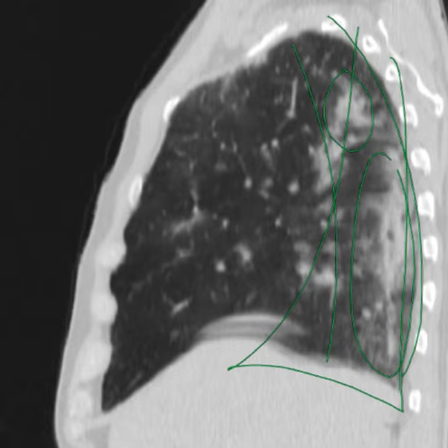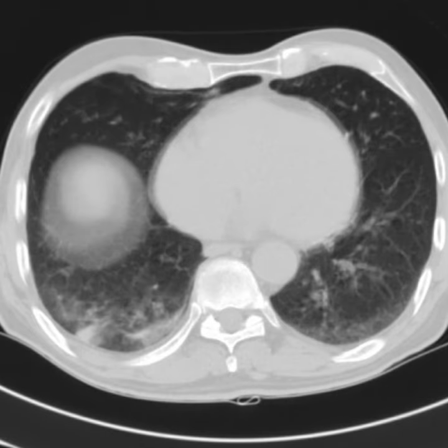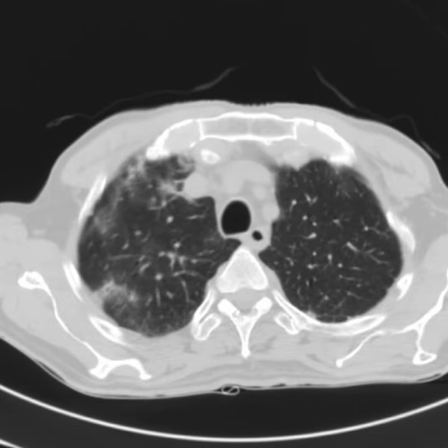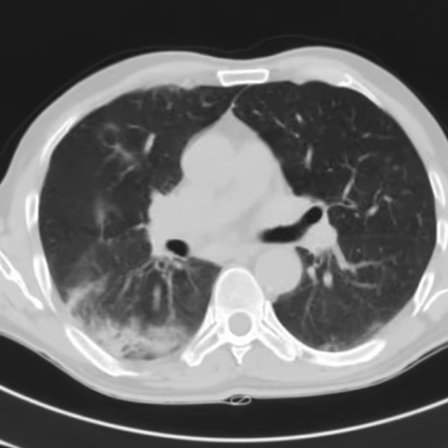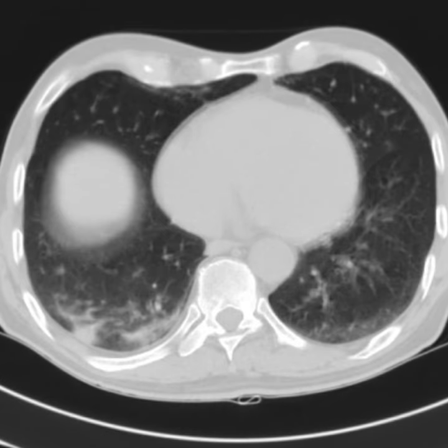So what about other kinds of interstitial lung disease? For example, non-specific interstitial pneumonia. First, non-specific interstitial pneumonia is more common in females, and it usually presents with ground glass opacity, but usually it involves both lungs in a diffuse symmetrical manner. Very good job. So what's your primary differential diagnosis?